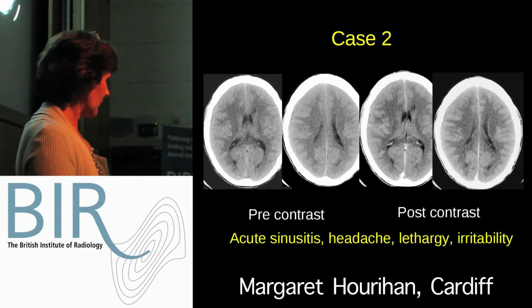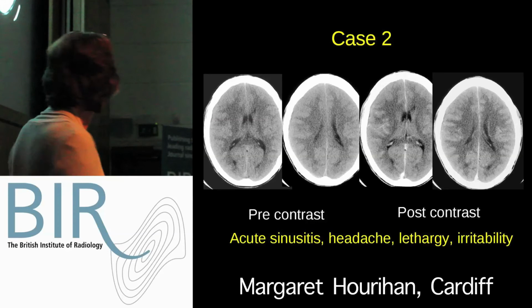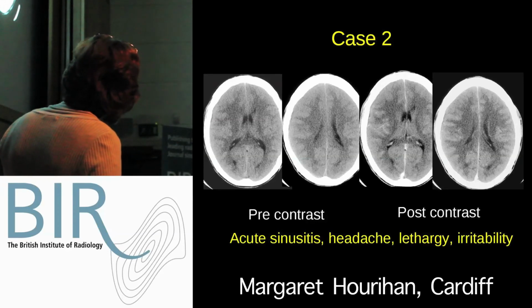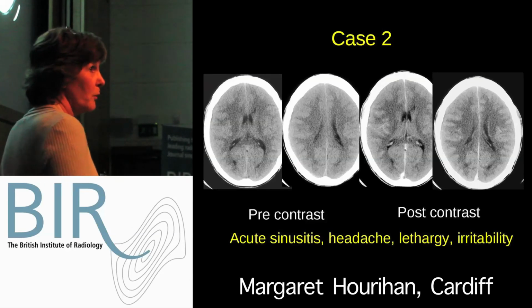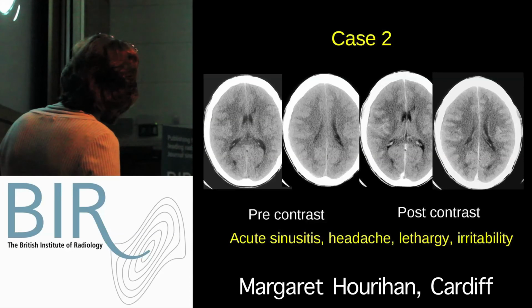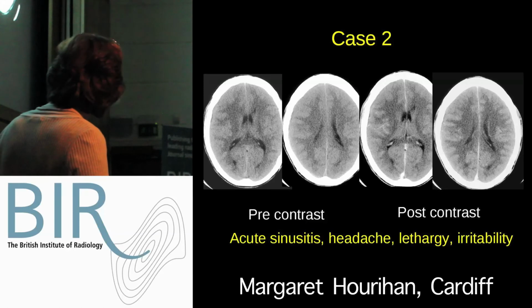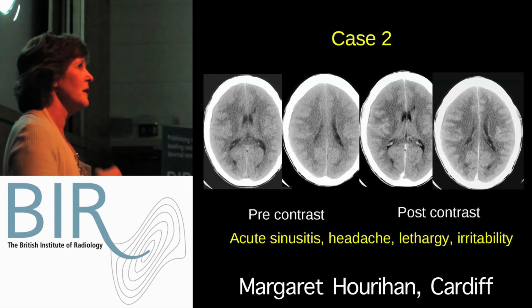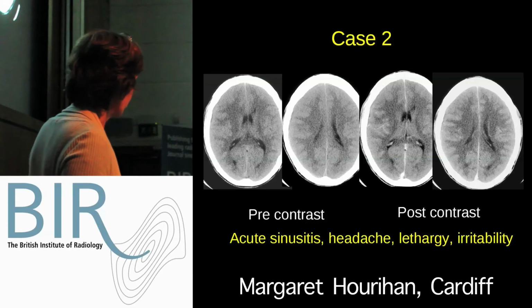Meningitis? It is meningitis. We didn't have any relevant history beforehand, and when this came through, it was thought she came over to us from another hospital with a subarachnoid hemorrhage, was what we were told. But obviously you can see that she's got dilated ventricles, communicating hydrocephalus. You can see that her cisterns are all slightly high density, so you can appreciate why somebody thought it could have been a subarachnoid hemorrhage. But that layering in the occipital isn't really bright enough for that. And she definitely had a pneumococcal meningitis.